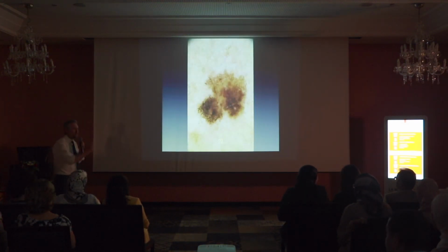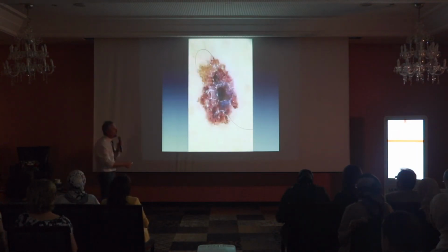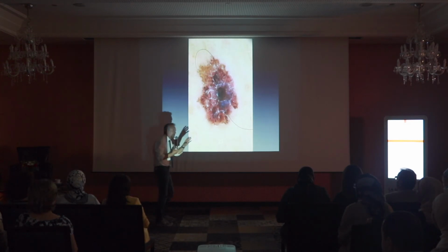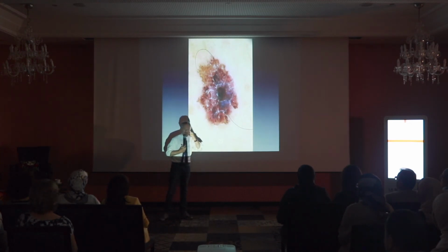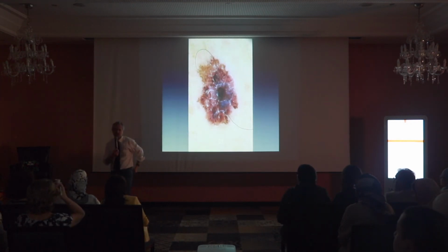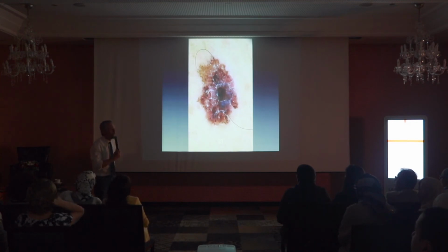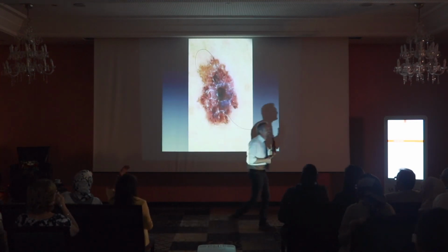And now, what do you think about 22? Melanoma. Okay. What do you think about 23? Melanoma. Also, these 2 lesions have something in common. They don't look similar, because this is, in my view, more thick than the previous one. In fact, the previous one was in situ. This is 1 millimeter. But there is something in common. What do you think?